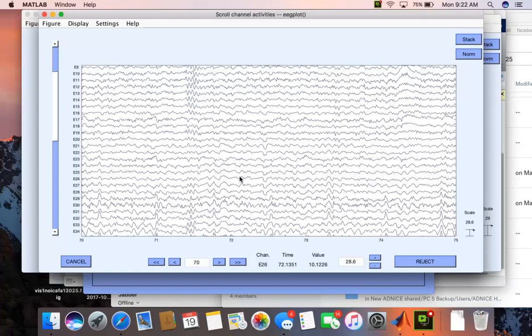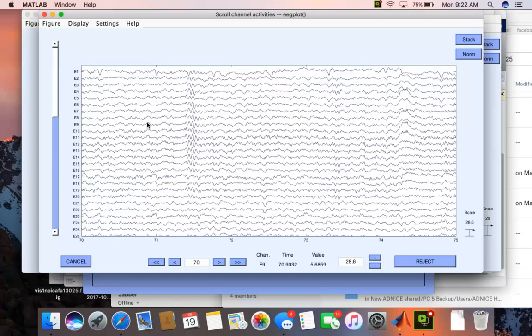A lot of times when you collect an EEG, you're trying to find out what different scenarios do to the brain waves. So it's always a good idea when you're doing that to collect a set of what we call resting state data first. And that's what this is. It forms kind of a baseline. It tells us when this person is at rest and their eyes are closed and they're relaxed and they're not being cognitively taxed. They're just sitting in a dark room with no sound stimulation, no light stimulation, and sitting still. This is just getting kind of a baseline of their EEG.